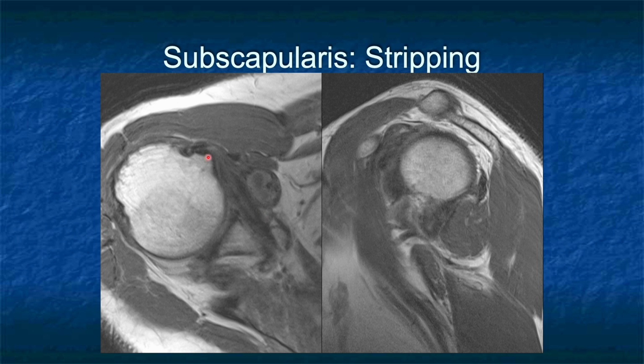One of the things besides normal subscapularis tears, with the subscapularis tears and subluxation of the biceps, is you can see that there's continuity of the subscapularis fibers, but the patient may have lost function.